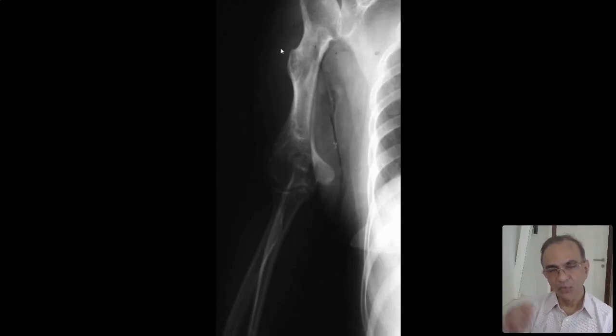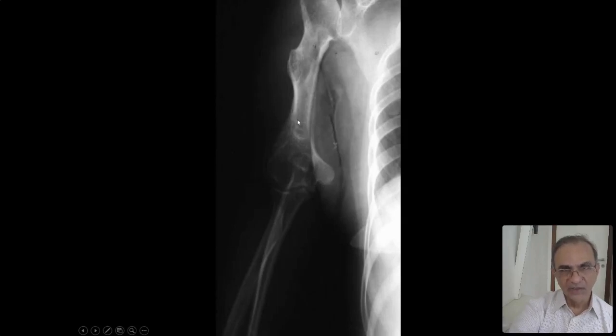So what you have to understand is that this is an abnormal looking bone. How do you tell an abnormal looking bone, besides that it is short? You don't have what's called normal tubulation. In a normal bone, as it comes from the diaphysis and goes toward the widening of the epiphyseal region, there is normal narrowing, which is called tubulation.